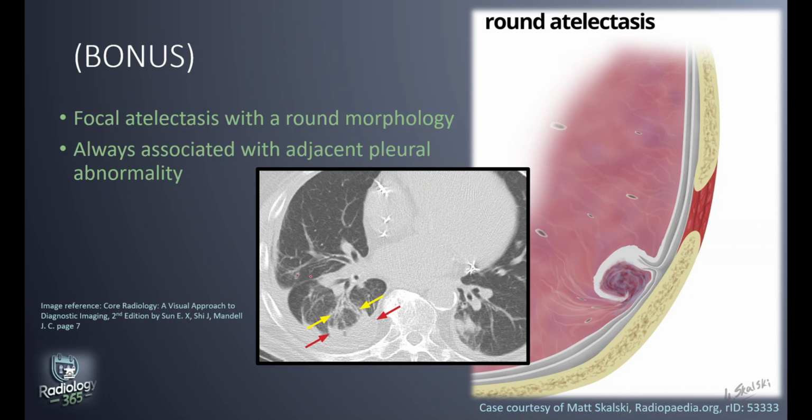That's the curved appearance of the pulmonary vessels and bronchi leading to the lesion. If you look at these, they make the lesion appear to have a comet tail. That's what we call the comet tail, a curved appearance of the pulmonary vessels and the bronchi leading to the lesion. So all these are suggestive of a round atelectasis here.